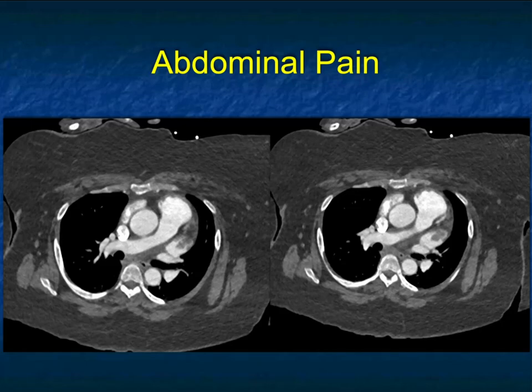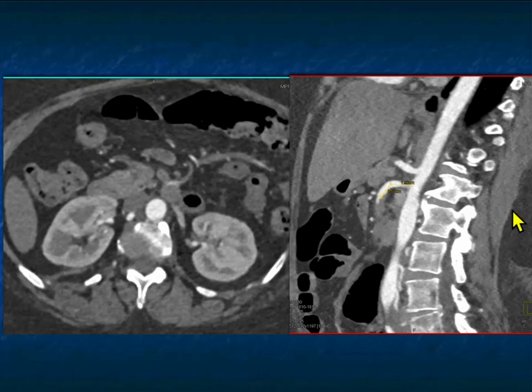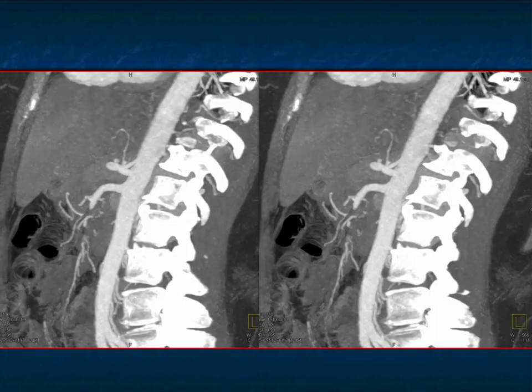Patient with abdominal pain, and you see clot in the patient's left atrial appendage, very nicely shown there. Then you scan downward and you say, well, I see the SMA, but wait, there's clot in the SMA right here. The bowel proximally is not dilated, but there's occlusion of the SMA. Importance of sagittal views to look at the celiac and SMA and IMA, very nicely showing you the occlusion, which will lead to ischemic bowel.